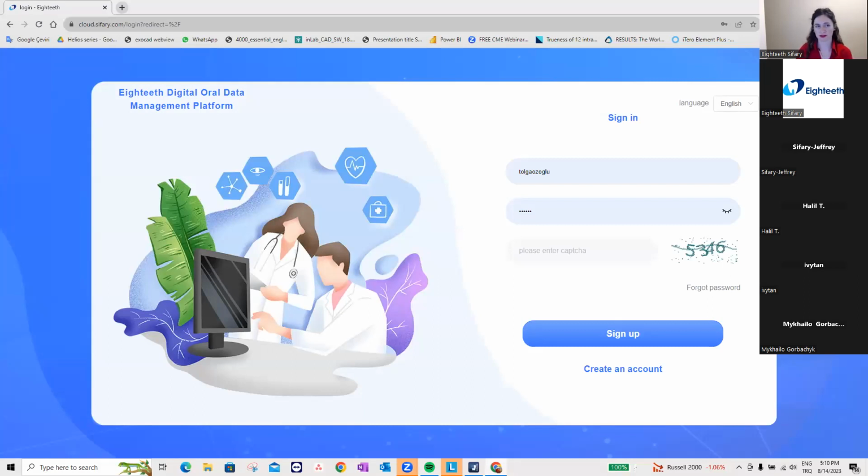Yes, this one. Oh, let me go. Yes, this is also our sign-in page, where I can reach out to my cloud base. And yes, sign in. Oh, sign in. Isn't it?